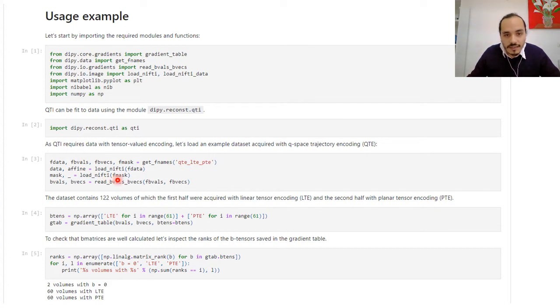In the following lines, we are just loading the directories into four-dimensional data. We are also loading the mask and reading the magnitudes of the b-values and the directions of the B tensor. As I explained, sometimes our scanners don't give the information of the full B matrix, but only the direction and the magnitude of its shape. Here we know the information of the shape a priori.